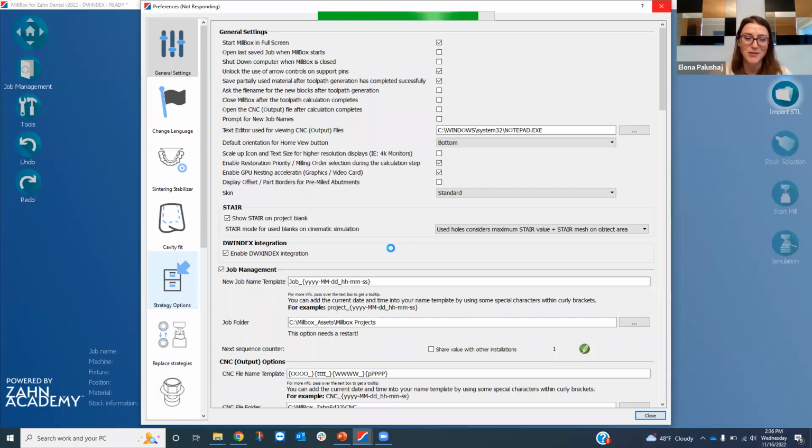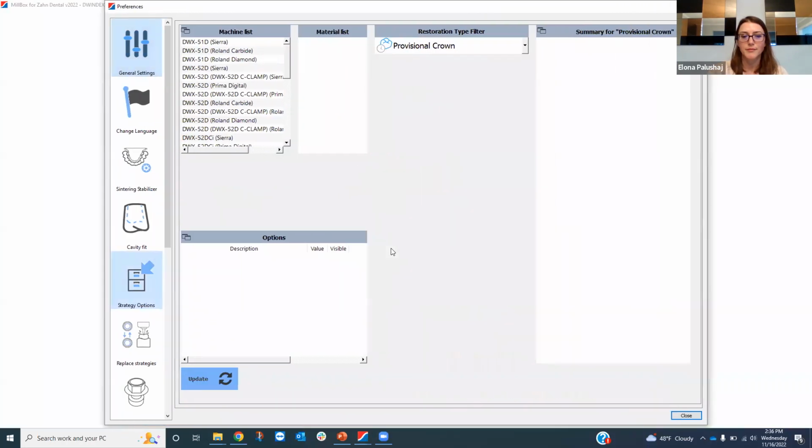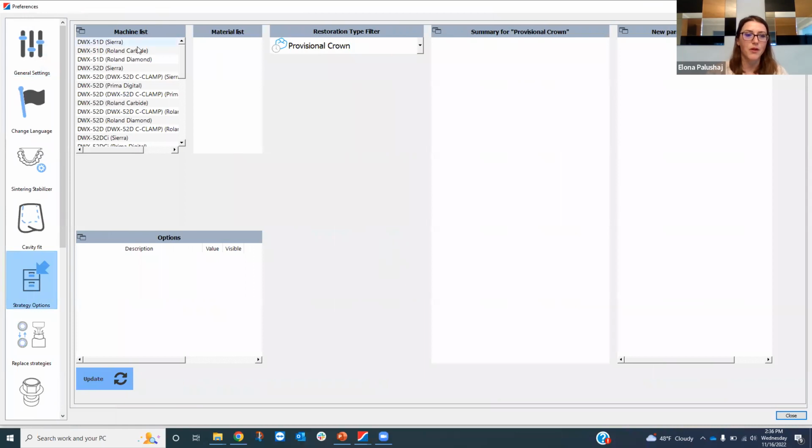That's why it's taking a while to load. All right, here we go.